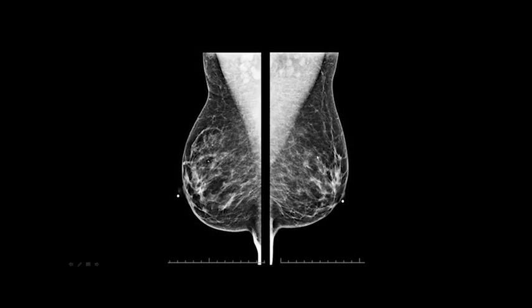All right, you can see here, these are beautiful images. I would pick these to send if they didn't have the clips in there, of course. They really don't like to see biopsy clips when you send it in. But otherwise, they're beautiful. Wide superior muscle, convex border down at a 45-degree angle. It meets 45-degree angle, even though it doesn't come all the way down to the nipple.